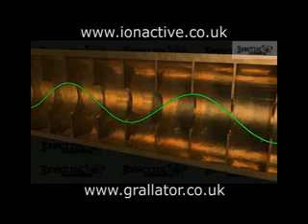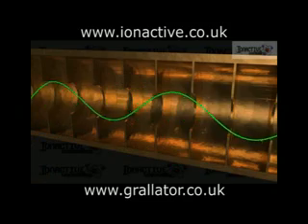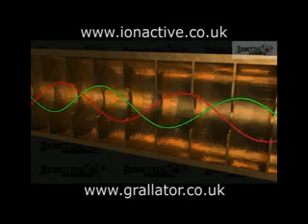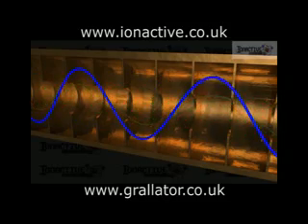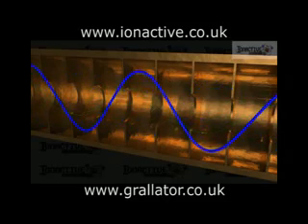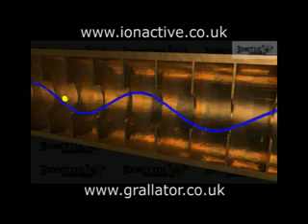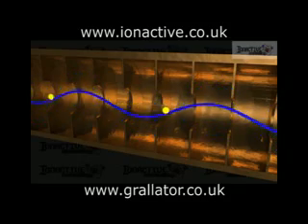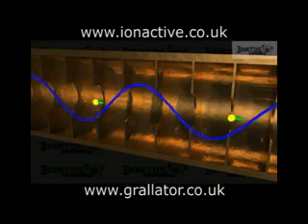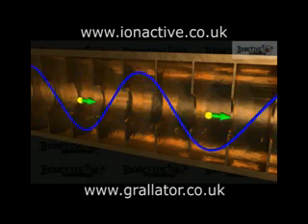An alternative method uses a standing wave that is set up by the superposition of the forward travelling wave and its reflected image. The result is an oscillating microwave field that resembles the vibration of a plucked string. The forces on the electrons are as before, however, it can be seen that the field is zero for some of the time. If the cavities are tuned so that the electrons can cross one whole cavity during this time, a constant acceleration can be applied.